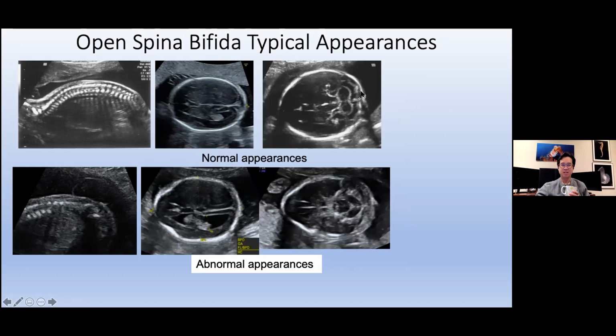Here's another example, same thing. This is the posterior fossa now that we're looking at, okay? Normal cerebellum, thalamus, CSP. Thalamus, here's your cerebellum. It looks like a lemon. There's also, remember, this is your cisterna magna. There's effacement of the cisterna magna.